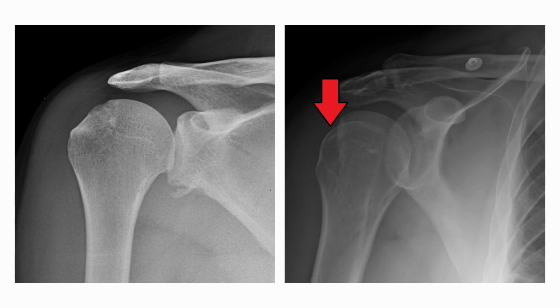Now this is a shoulder joint, and on the left image, if you look at the inferior glenoid, there's an avulsion, and they have marked an arrow on the top of the humerus, and they are asking which lesions these are. These are the lesions commonly seen with shoulder dislocations. The one on the top is Hill-Sachs lesion, and the one at the bottom of the glenoid is called Bankart's. How we remember is you are on top of the hill, whereas the river bank is at the bottom.